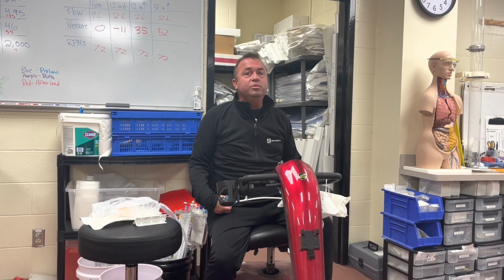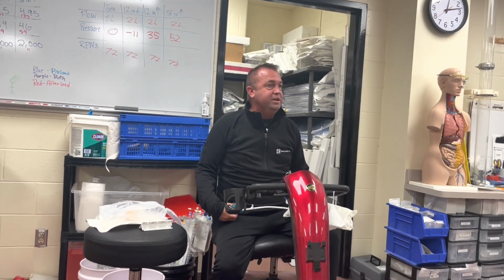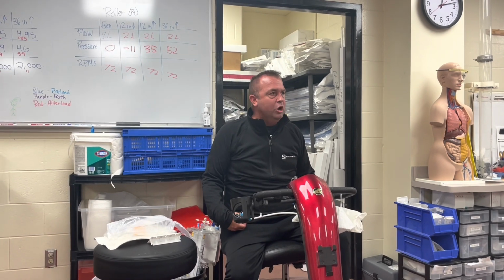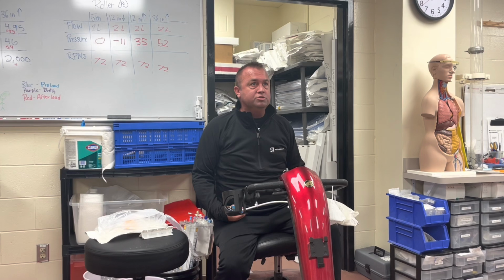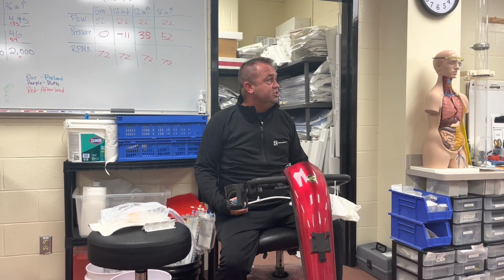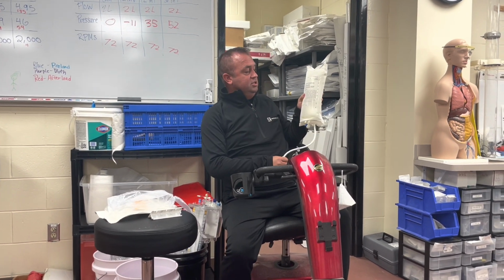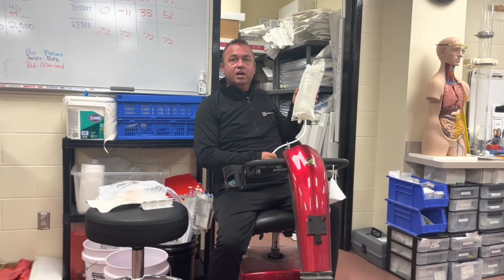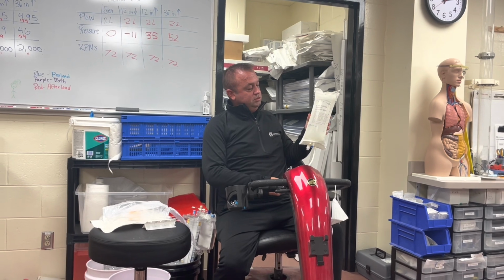Some of these patients that we have in cardiovascular surgery, they take a lot of drugs to keep their blood pressure down, don't they? Well, guess what drugs they don't take a lot of times right before they come into surgery? Those same drugs, right? And so when they come into surgery, it's not uncommon for us to see systolic pressures of 180, 200. I've seen as high as mid 200s or higher. So we want to keep this at a minimum of 300 pressure or greater.